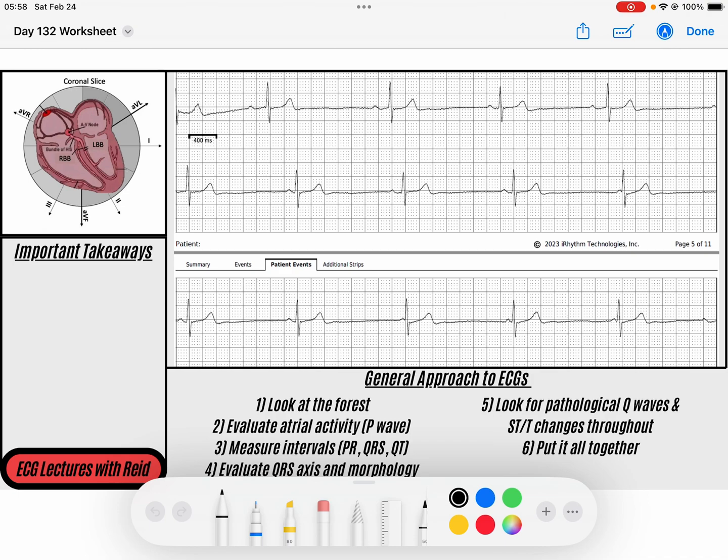So the first thing we're going to note is that this is a Holter monitor, right? Holter monitors are wearable devices that record from essentially just one direction your cardiac rhythm. So this is not a 12 lead, and this is actually a continuous strip. This is just line 1, line 2, and line 3, but they are all continuous with each other like you're reading a book. So we're going to start from the top and work our way down. I thought this is a great rhythm example.